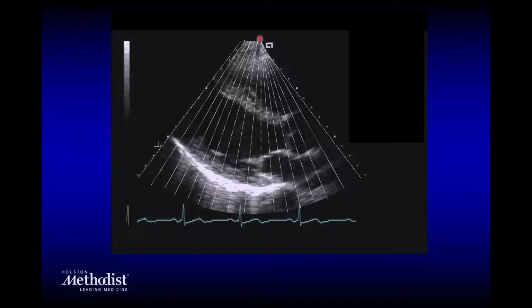Now these scan lines scan throughout the sector and then come back, and you can have 160 of those scan lines. Notice also one thing, that they're not completely parallel. So further down in the image, they're going to be more spaced, and that will give you by itself a poorer resolution to discriminate various dots.